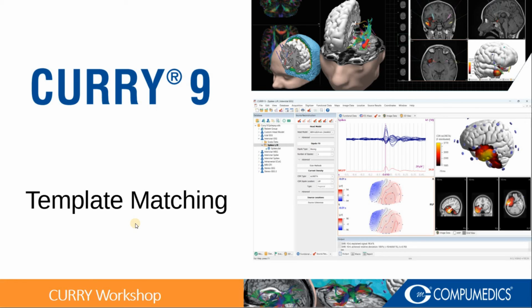In this short video, we will go through the template matching functionality in the Curry software. Template matching is a powerful tool which can help us find signals which occur multiple times throughout a recording. We can do this by defining a template, which can be an epileptic spike or an artifact, and then use certain criteria to find how well other instances match our template. In the case of Curry, we use amplitude as well as correlation. Let's jump to Curry and see an example.